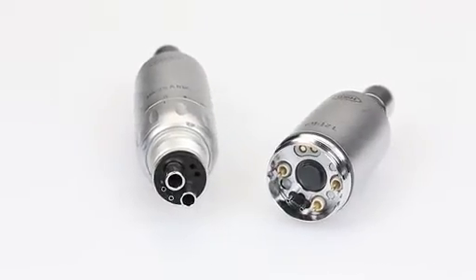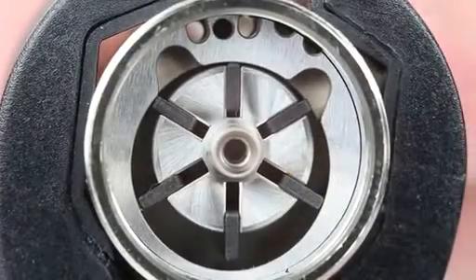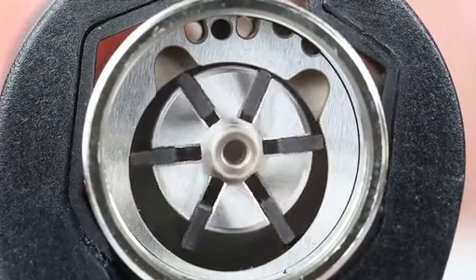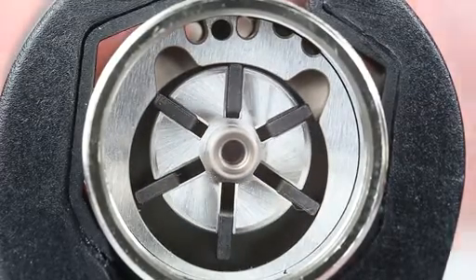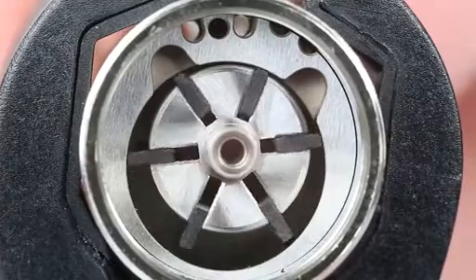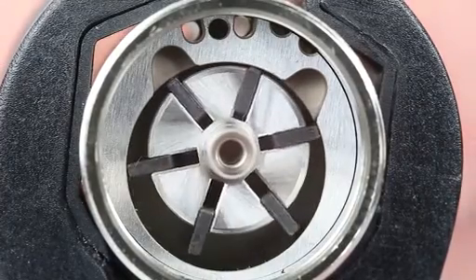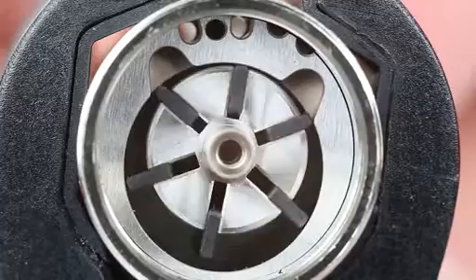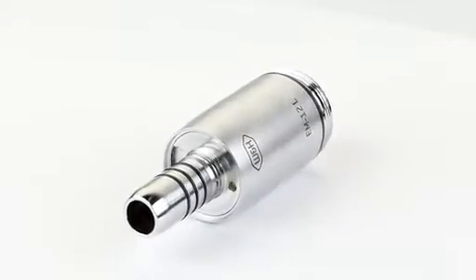With air motors, like turbine handpieces, a rotor is made to move using compressed air, and this generates the required rotational movement. This technology is very simple, robust, and good value. However, the speed range is only roughly adjustable, with a range of only 5,000 to 25,000 rpm.